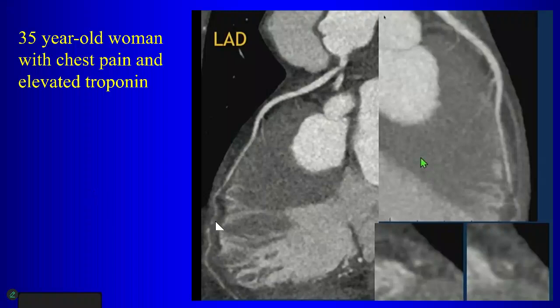Well, there's kind of a diffuse stenosis there, right? We don't really see coronary artery disease in terms of calcifications or plaques, but we see this decreased opacification and this abrupt tapering. That's the way to describe this, an abrupt tapering of the vessel. And you can see here on your cross-sectional views, the vessel looks very fuzzy, and there's an abrupt tapering of the vessel. And around here, there's a little bit of increased attenuation of the fat directly around the vessel, okay? So in a young woman with this history who has these findings on CT, let me show you something else.